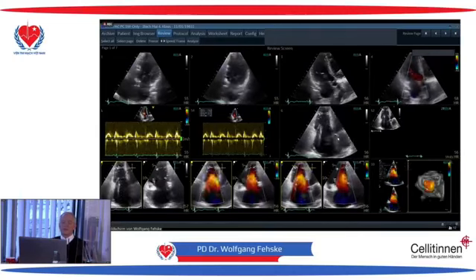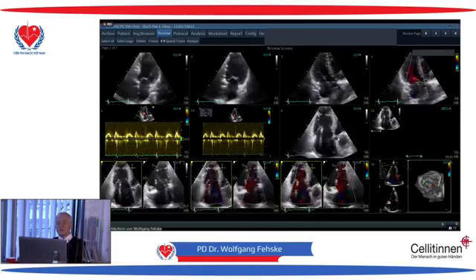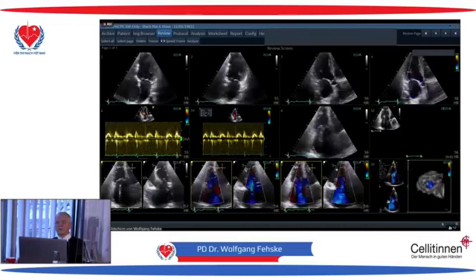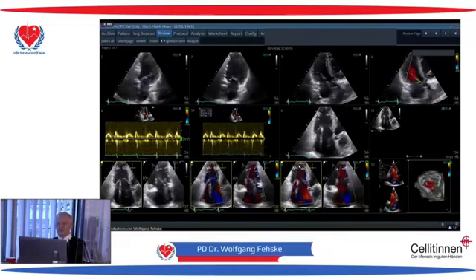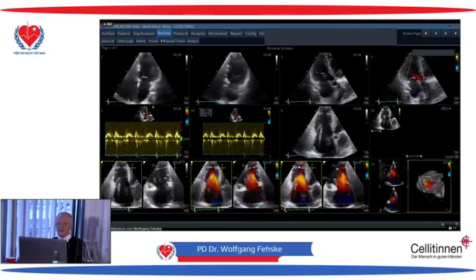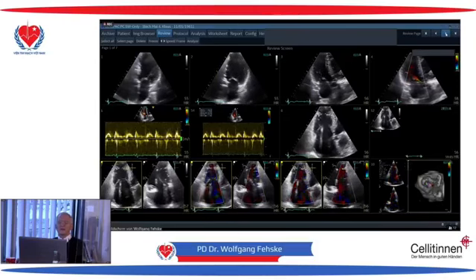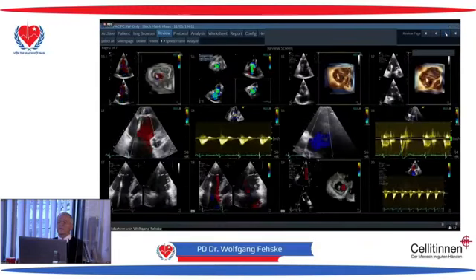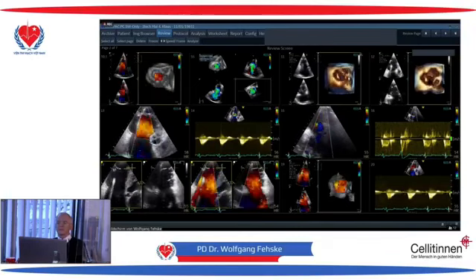And so we have the suspicion that this is a restrictive tricuspid regurgitation due to, like in the left ventricle, past ischemia and a restricted tethering of the leaflets of the tricuspid valve. Okay, we can try to increase this diagnosis or to make it even a little bit better. Okay.